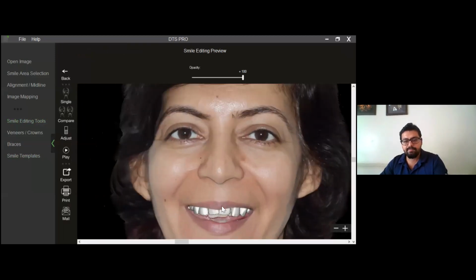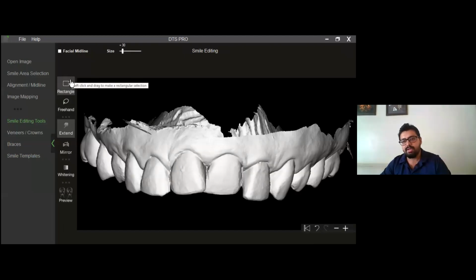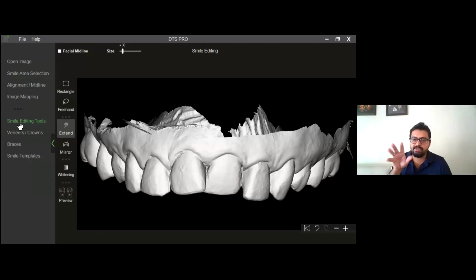It shows me the effect that could have on the teeth once I intrude the teeth, or once I intrude the STL scan. Of course, I can go a little more into detail of that, but I don't want to bombard it with a lot of information of how that is to be done. But what I primarily want to project and put across here is you can even use scans and superimpose it on the patient's actual smile and see the changes in 3D that would be happening on the scan. Those same changes can be reflected in the patient's smile photograph as well.